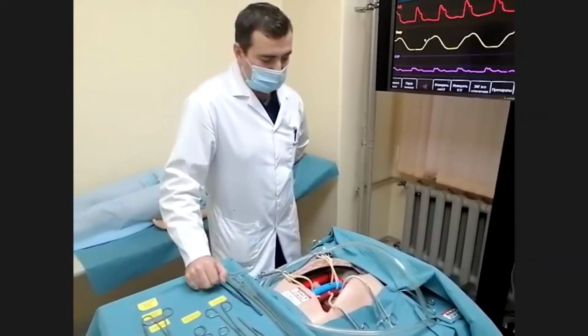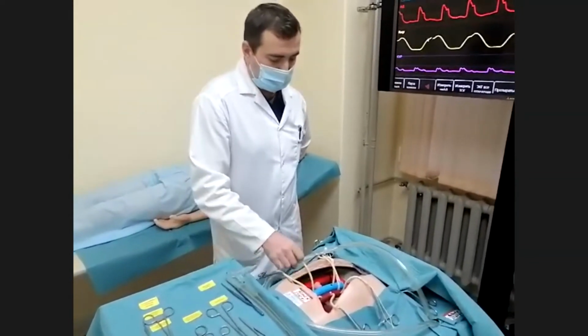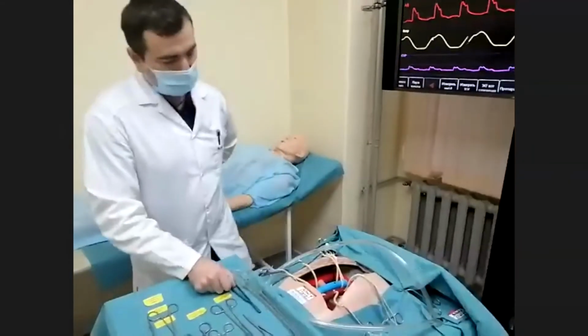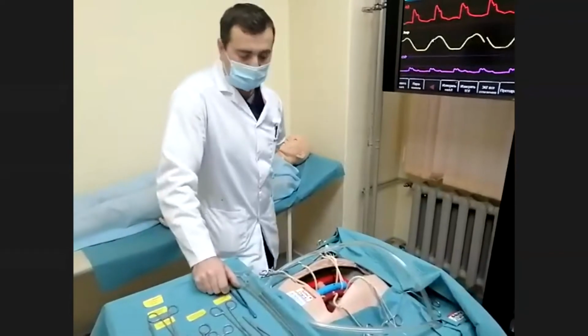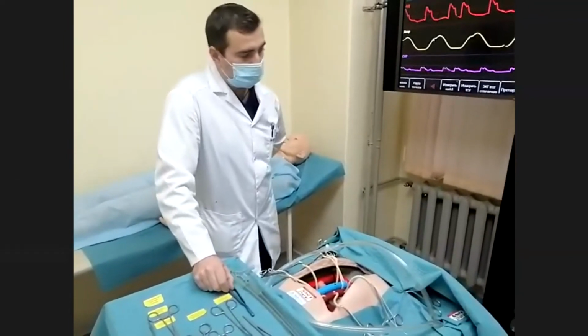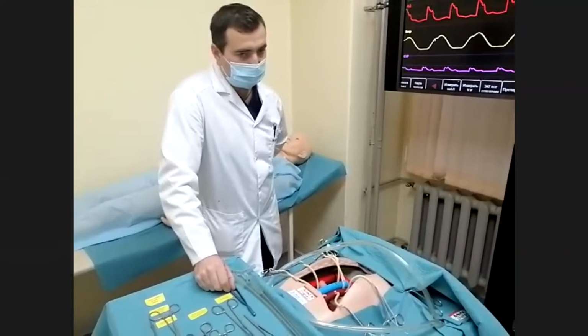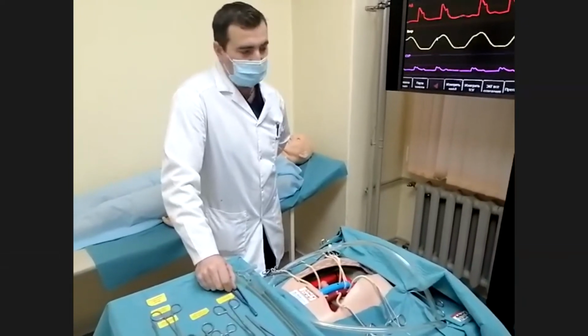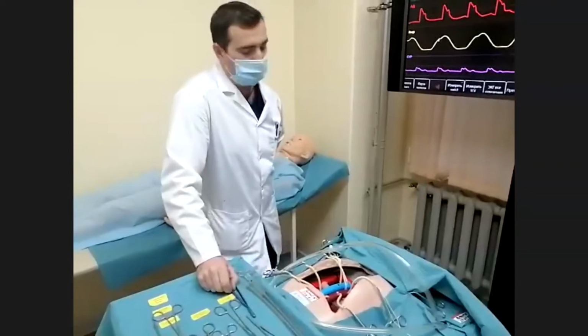Very important. So the system comes with 2 separate computers and a patient monitor, right? Yes, right. Okay. Do you need 2 different people to control the echo? No. One is enough. Just one person.